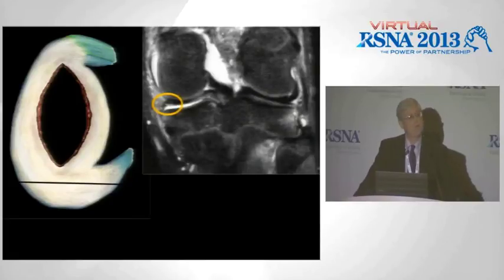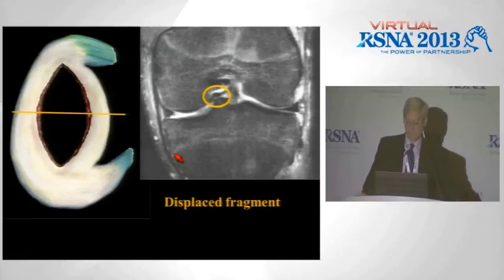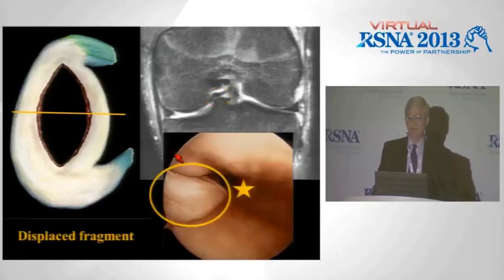In the coronal plane, our far posterior images may look relatively normal. Here we're probably at the edge because we are seeing a little abnormality that's touching a free edge. As we move more toward the body of the meniscus, we will see blunting because we've lost meniscal volume because of its displacement. So again, our job, once we see the abnormality, the tear, is to find where that piece went, and they always go into the intercondylar region. We can see it quite nicely here as well.